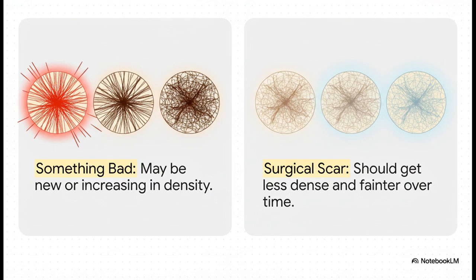This is where old records are gold. A radiologist will immediately pull up any prior mammograms they can get their hands on. Think about it. A surgical scar is just part of the healing process, right? So over the years, it should actually get fainter, less dense, and harder to see. But what if that area of distortion is getting more dense, more obvious over time? Whoa, that is a massive red flag.